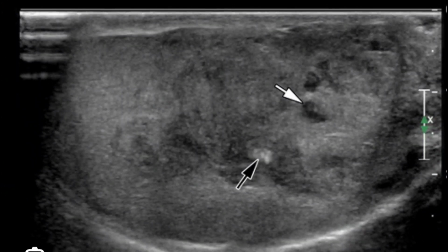What I'm going to discuss about the importance of the seminoma is that you should have all these points in your report. Your report should give the exact size, whether it is in the right or left testes, whether it is unifocal or multifocal, whether it is hypoechoic or heterogeneous, whether it is confined to the tunica albuginea or it is crossing the outline, whether there are any confluent nodules in it, whether it has replaced the entire testes or not, whether there are any cystic components within it, or any cystic degeneration or debris or calcification. I do hope this will be a worth watching video, and this will help you to examine the patients correctly and to find the testicular seminoma immediately and alert the red flag. And all this information should be in your report.